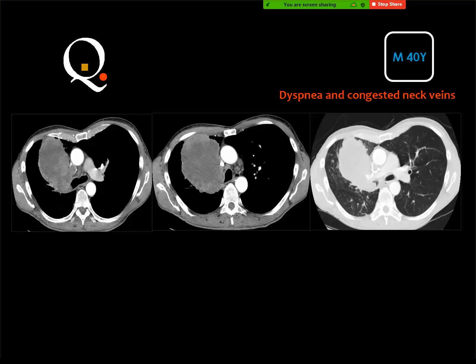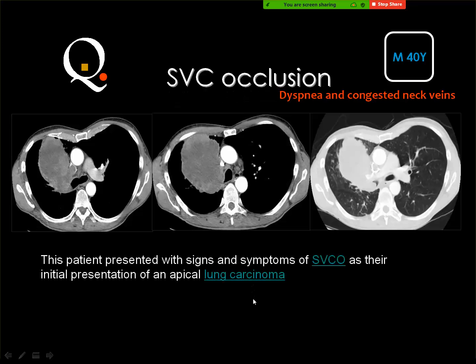Bronchogenic mass with superior vena cava thrombosis. Right bronchial invasion? No, this is not true, but there is some encroachment on the right main bronchus, and there are some lymph nodes here. This mass in the lung of an adult should be considered a bronchogenic carcinoma until proved otherwise. The superior vena cava is filled by tumor thrombus, and there are some lymph nodes in the aortic window.